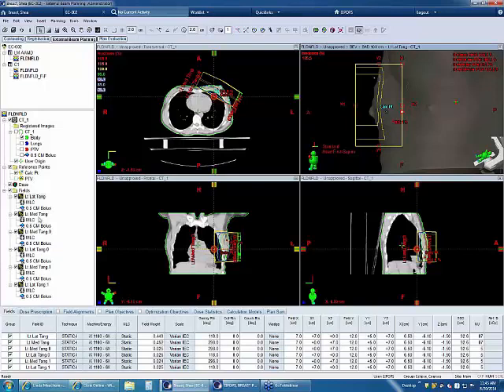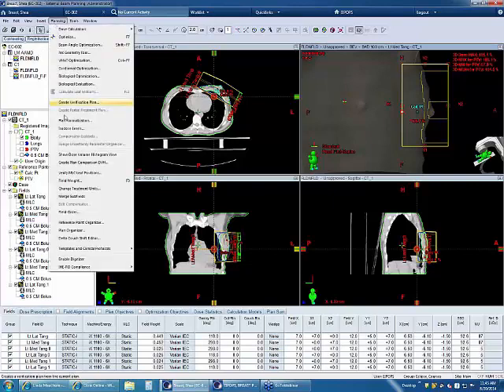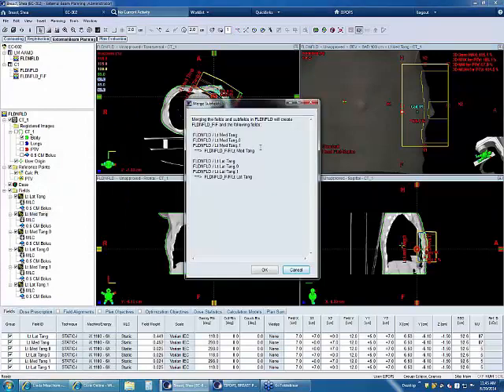I'm going to go to my medial and, again, show all MLC apertures, so you can check it. This one's farther in than this one, not farther out. So that looks good. To merge subfields is extremely easy. This takes this field, leaves it intact, and merges it into two fields again. Let me come up to my planning and go down and say merge subfields. Now what's going to do this? My leaf motion calculator is going to do this. It's telling me that it's going to merge them all. I don't see any outliers, and I'll say OK.